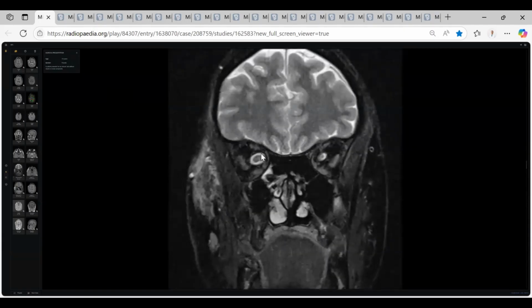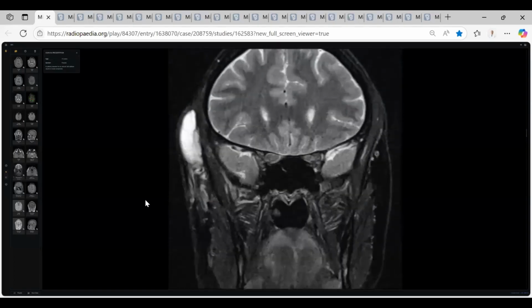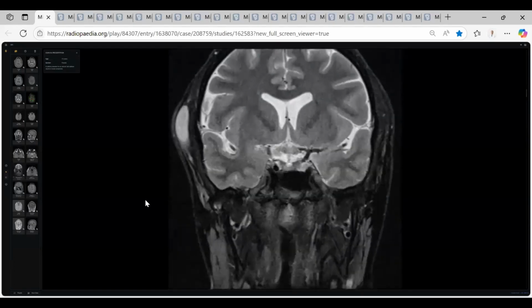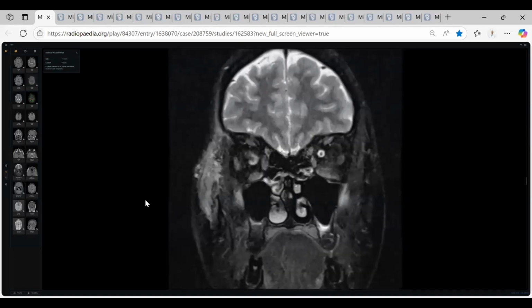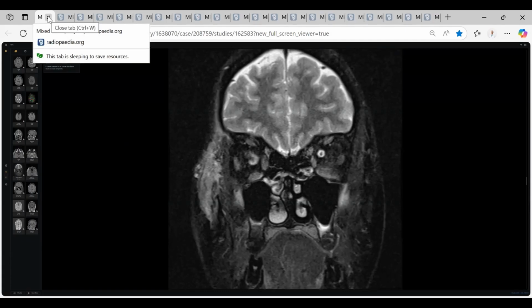See, my colleagues, this is not normal. And also this one, down, down, up. See, I think the chiasm also is bulky. So bilateral, at least optic glioma associated with right-sided plexiform neurofibroma. So two findings are enough in this case to diagnose NF1, and all of us know the list of management like screening of relatives, DNA, like this.